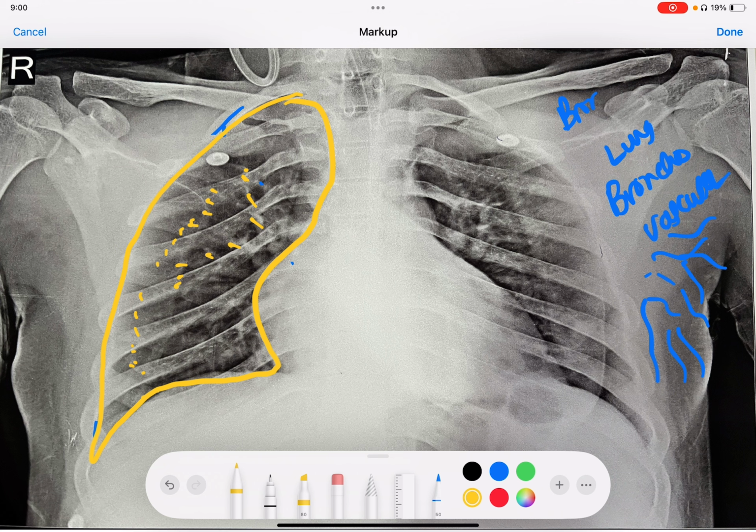But when we see on the left side, this is the left side, if you can see in this area, we can very clearly see a white line running from this. This is all lung. So I'll erase this so that you can see this very well.